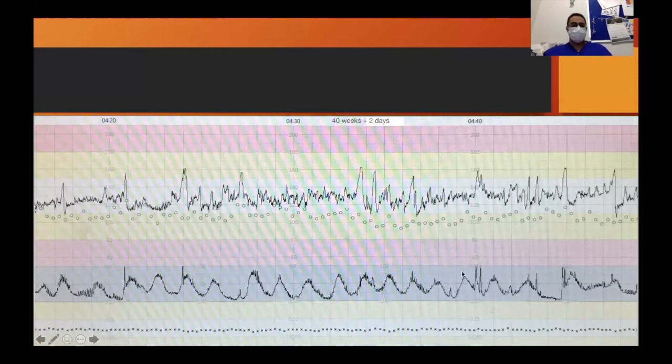The other thing is you can see how the contractions are now becoming almost, I mean, we're contracting about 1, 2, 3, 4, 5, 6, 7 in 10. That is a lot. Is she okay? Well, she has an epidural and she keeps on topping it up. Any bleeding? No bleeding. Uterus soft between contractions, for the 10 seconds that you have in between contractions.